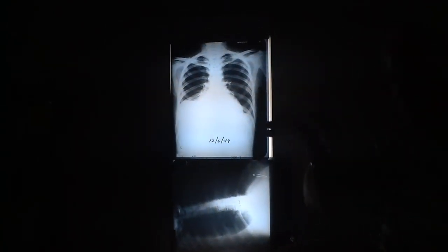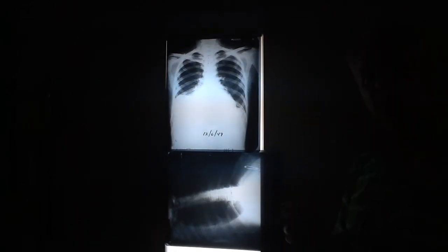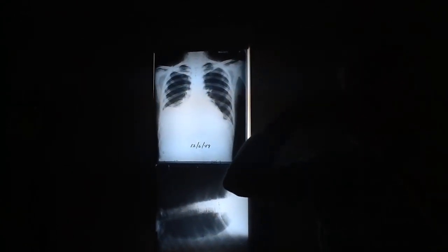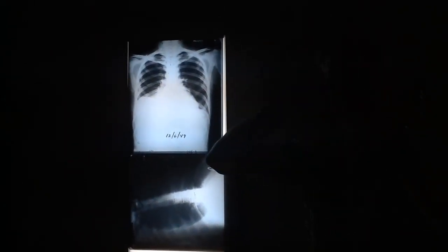It just lifts it up. Now, when it does it on the left side, if you've got a good gastric air bubble, then it's easy to see it, because the diaphragm should be sitting right there with the lung right on top of it. If you have a gastric air bubble and the diaphragm looks like it's up here, it's much easier to be suspicious of it on the left side.